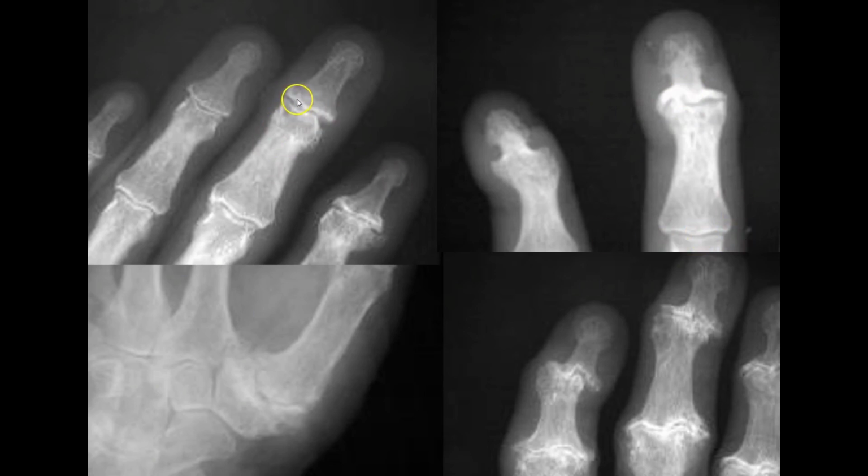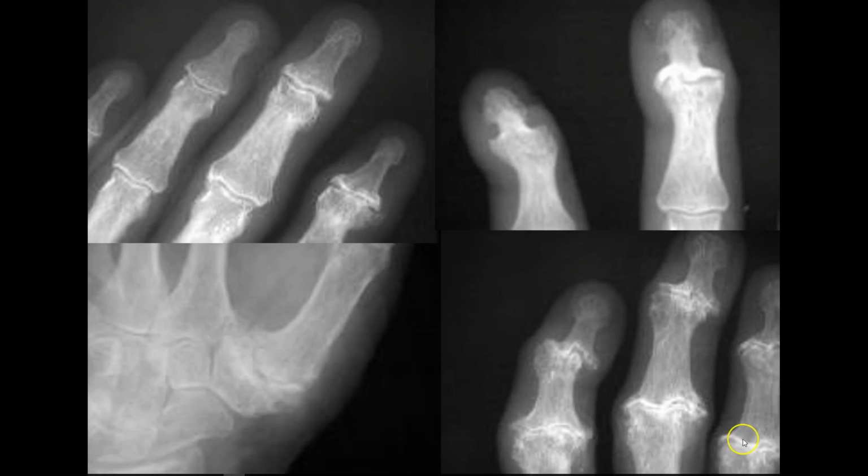We're just beginning. This is an earlier step of gull-wing deformity. Same here. But the PIPs look pretty good on this radiograph. This is a little less common presentation. We have clear evidence of DIP and PIP disease. And again, central erosions producing the gull-wing deformity presentation is of great interest to us. Move this down so you can take a look at this joint over here.